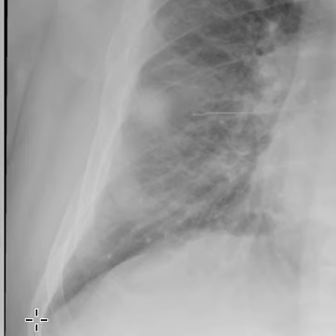Now coming back to our X-ray, the last part is that we need to assess these costophrenic and cardiophrenic angles, and we need to look for any kind of pleural effusion. So here in this X-ray, you can see that they're fairly distinct. You can quite demarcate and look at these angles.